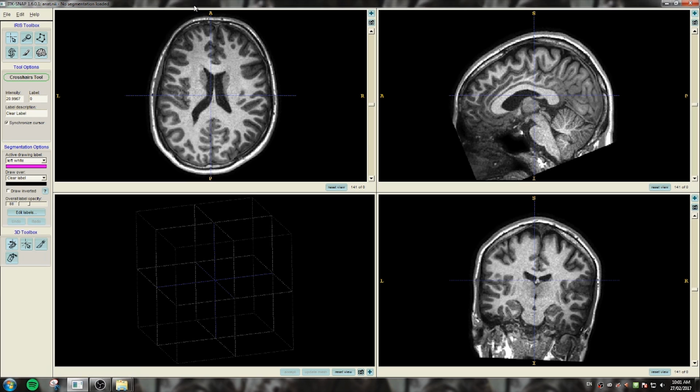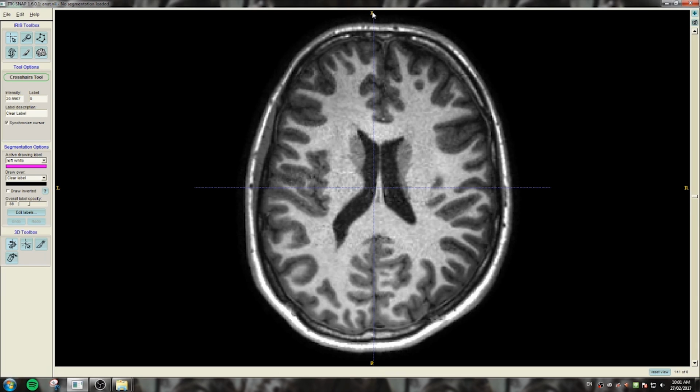So typically we start segmenting the left hemisphere, but you can start on the right if you wish. But essentially the way that I do it is that I first go through each view, so axial, then sagittal, then coronal. So I go through all the slices within each view and just flood fill it. So you have to go to the paintbrush option in the little toolbox window. So you can press the 5 key to use a shortcut, and then what you can do is increase the size of your paintbrush, decrease it, and you can also change the tolerance.